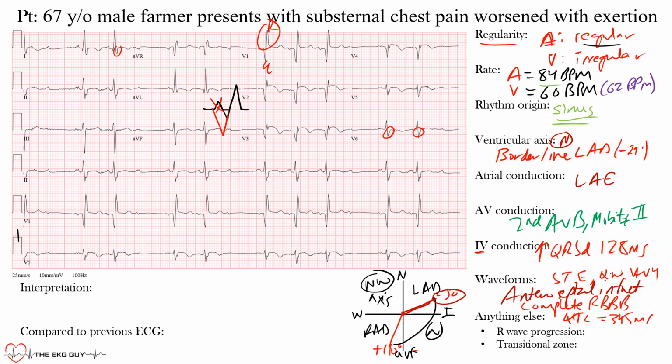Next, why may this QTc interval recorded by the machine be a problem? Well, notice we have dropped QRS complexes. The machine usually uses the Bazett formula, which takes into account the R to R interval. And if you have these changing R to R intervals, it's hard to trust the EKG machine, and that's probably why it's so low. So again, you have to be aware of this so as not to rely heavily on the machine.